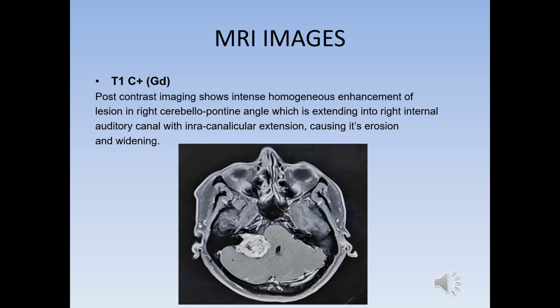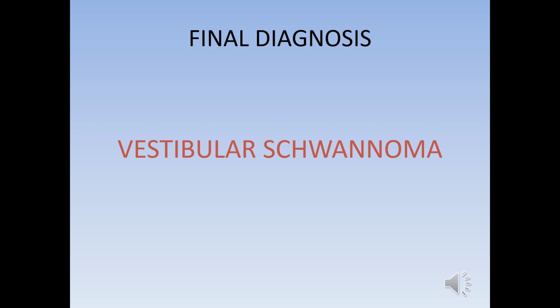Post-contrast MR study reveals intense homogeneous enhancement with evident extension of the lesion into the right internal auditory canal with intracanalicular extension causing its widening and erosion. Eventually, the diagnosis of vestibular schwannoma was established on the basis of clinico-radiological findings. The diagnosis was confirmed later on by histopathological analysis.